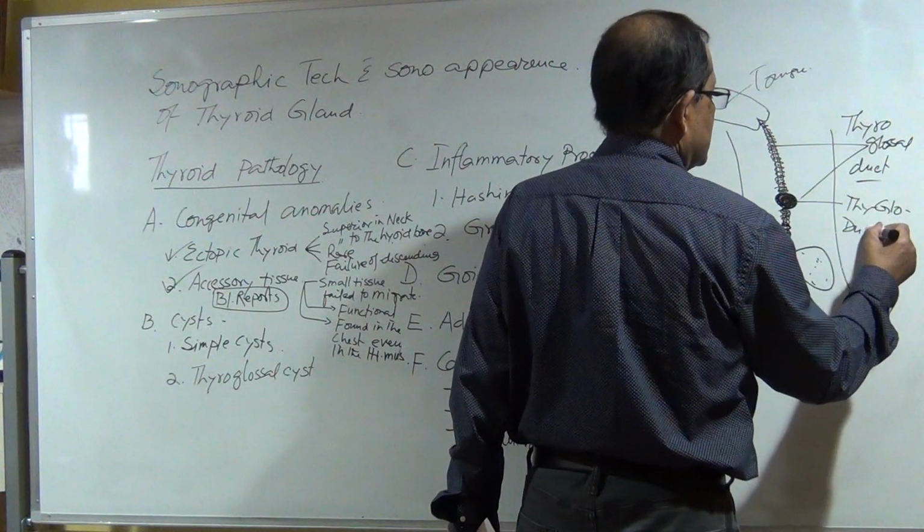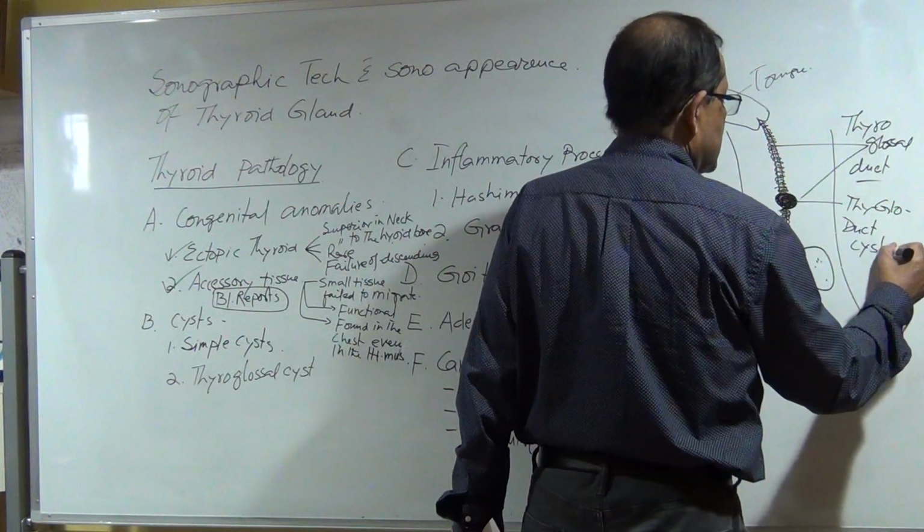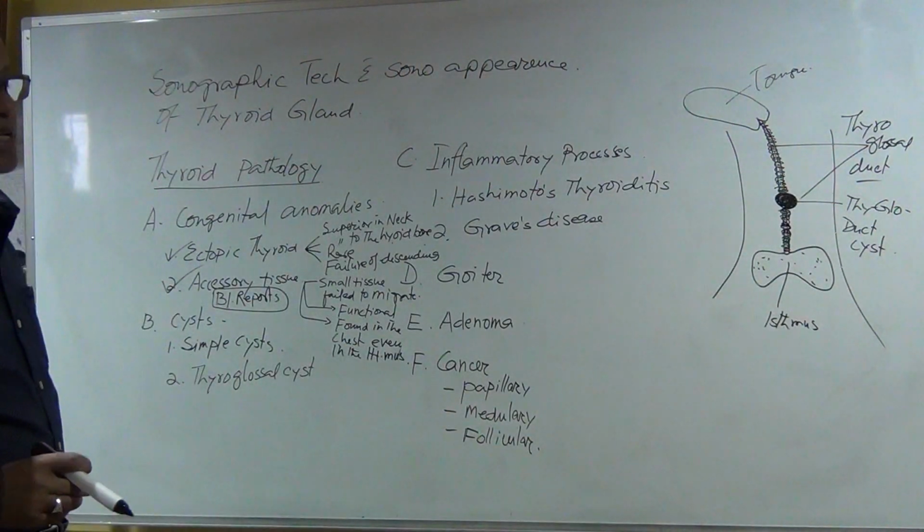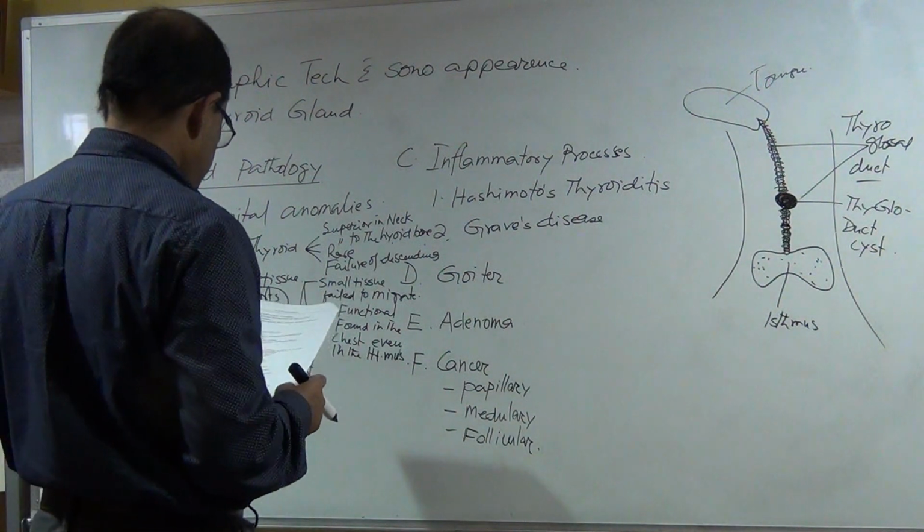It exhibits the same 4 criteria of the simple cyst.